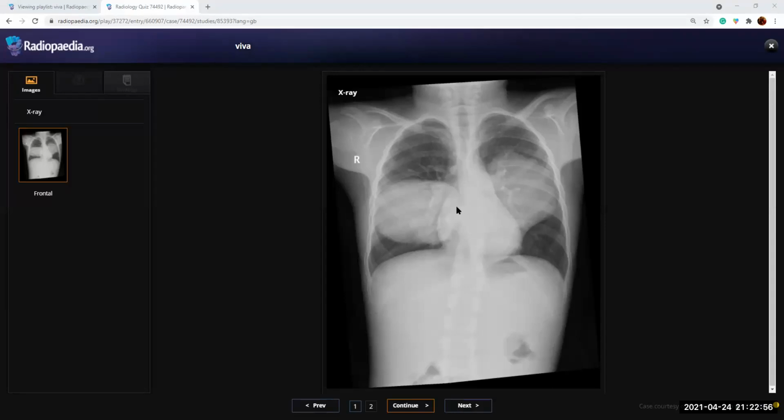Yeah. And why are you able to see the lung markings through this? Because it's in one lung lobe, and the other lung lobe will be posterior or anterior. So in the right side lesion, if it is in the lower lobe, the upper lobe can be seen posteriorly. Similarly on the left side. But usually the pulmonary hydatid will not calcify. So I'll inform this to the clinicians and refer to pulmonology for further management.